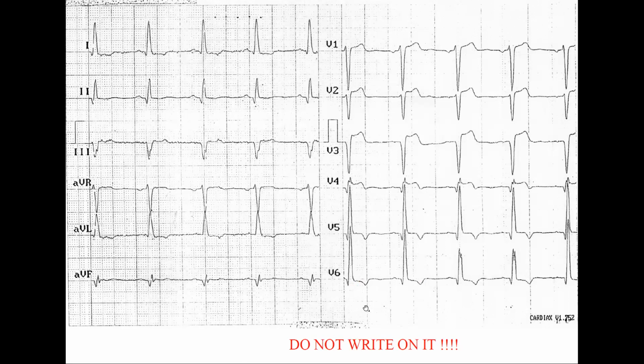Okay. Now let's see who has this one. Okay, Luis. Luis. Yes, can you hear me? Yes, hello, we can hear you very nicely. So hopefully you can solve this ECG very nicely as well. Okay, so I think it's rhythmic. Very good.